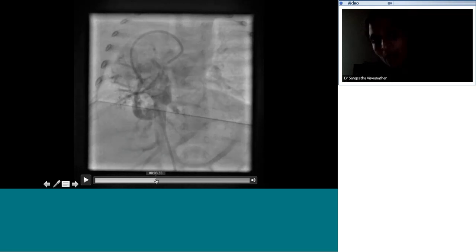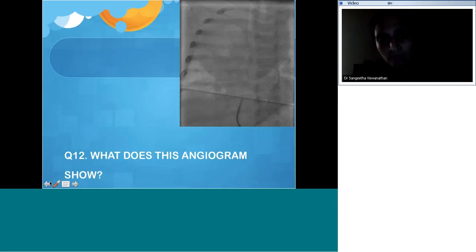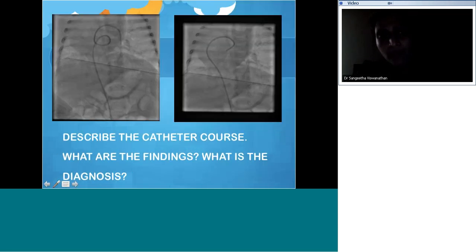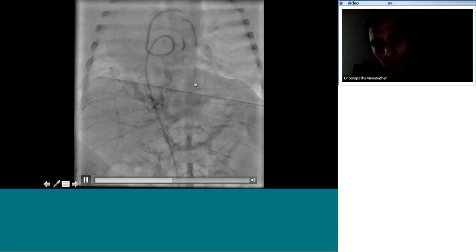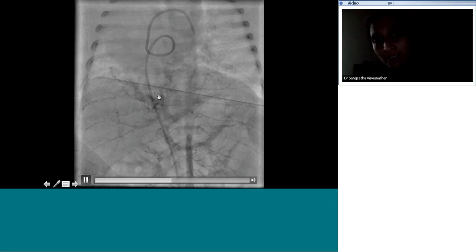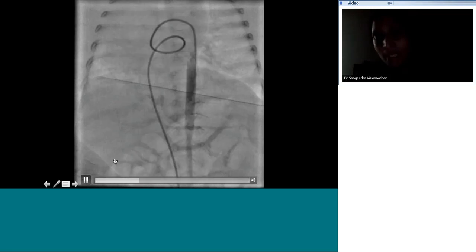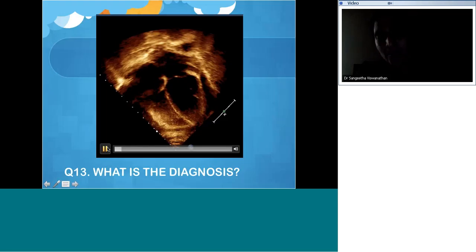Okay, so you have anomalous drainage of the vein, and on the previous angiogram, we saw how we had this injecting into the descending thoracic aorta. We saw that we had some anomalous arterial supply as well to the right lower segment. Of course, that has to be shown in a clearer fashion. Okay, but yes, well done.